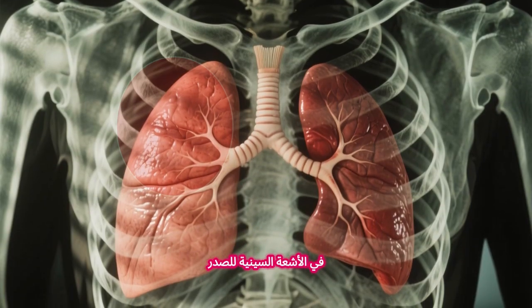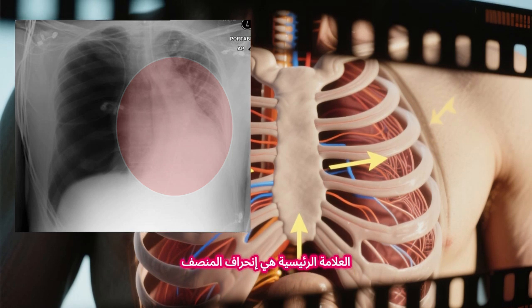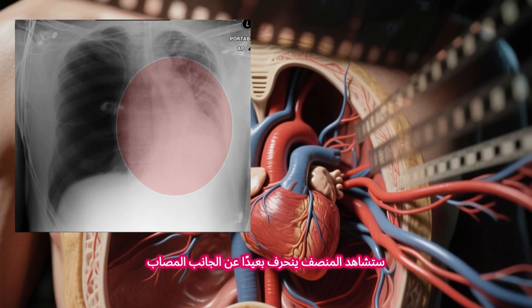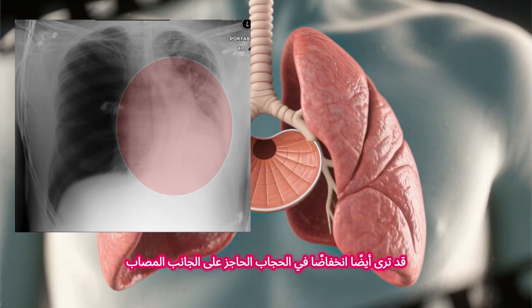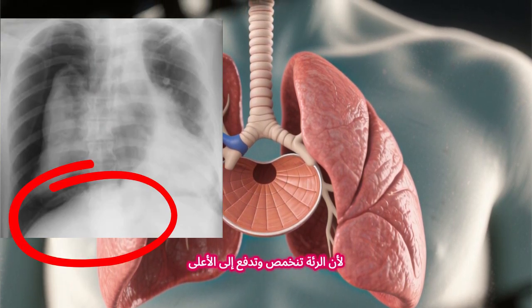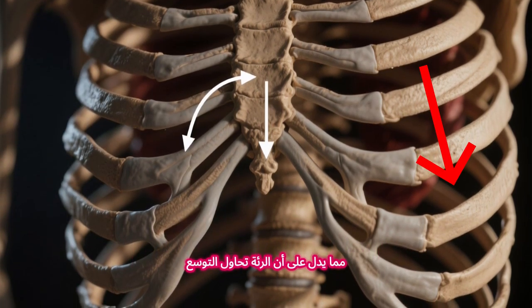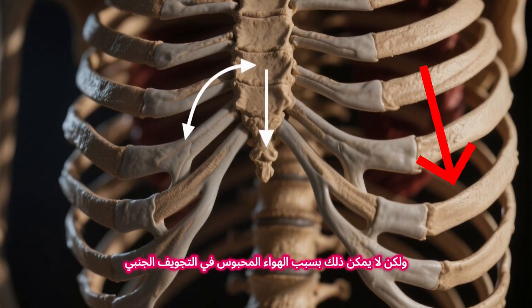On chest X-ray, there are both direct and tension signs. The main one is a mediastinal shift. You'll see the mediastinum shifting away from the affected side, meaning the heart and great vessels are being pushed to the opposite side. You may also see a depressed hemidiaphragm on the affected side because the lung is collapsing and pushing upwards. The other thing you may see is widened intercostal spaces, which indicates that the lung is trying to expand but can't because of the trapped air in the pleural space.